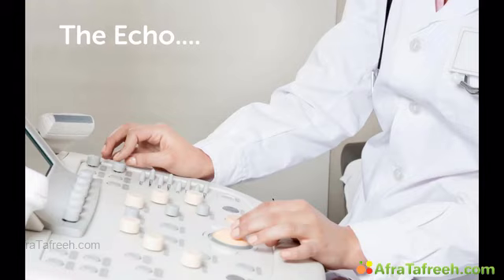And Maria asked, should we do TDI measurements? Well, Maria, I know this is something that has been proposed, especially at the time the big studies were performed to test if echo helps in CRT. And my clear answer is it's useless. It does not work. I think there are so many reasons why it doesn't work.